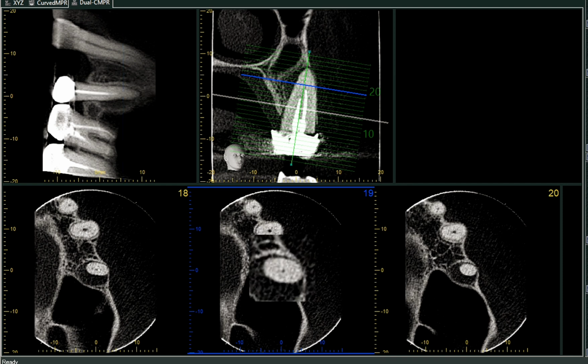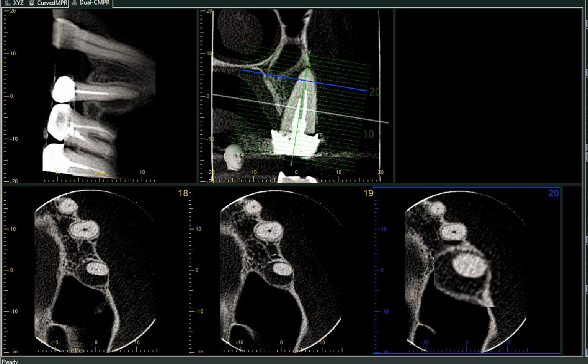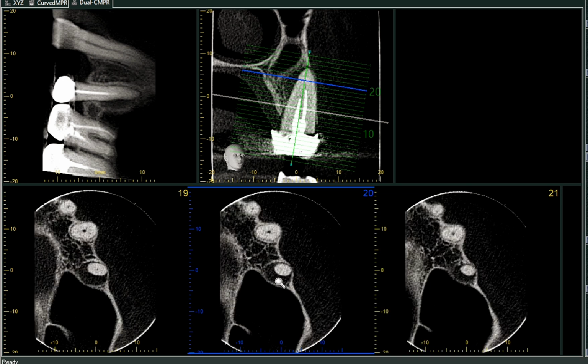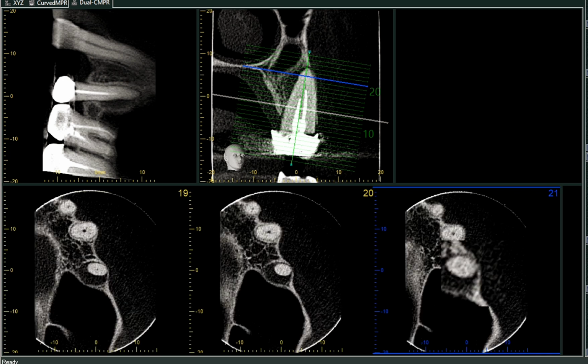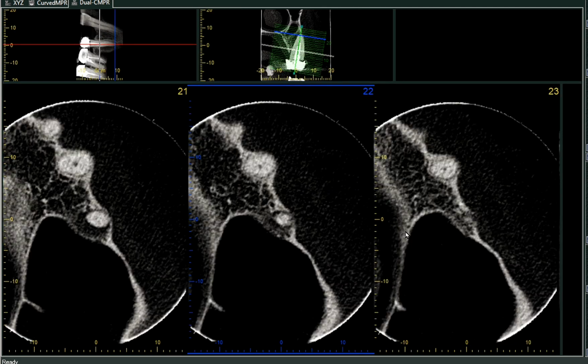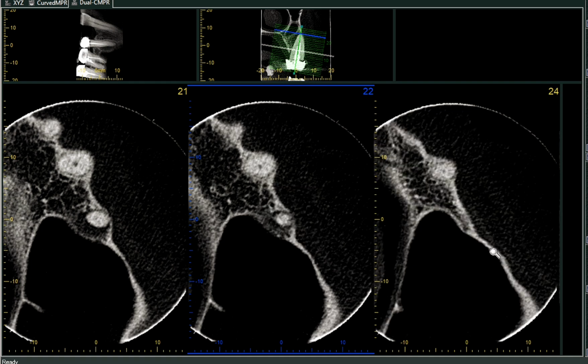You can see this is short of apex. So there's a single root canal exit. It is not very well evident because the biomechanical preparation may not have been completely done, because of which the radiolucency is not seen. As you go apically, you can check it or zoom the image. There are chances of a lateral canal being present over here, where the radiolucency is present.